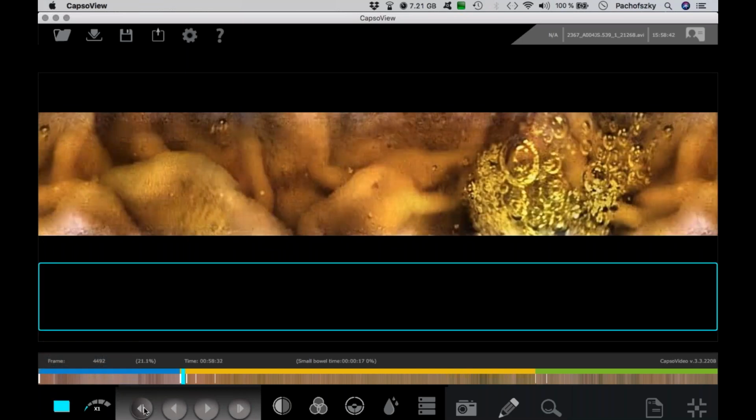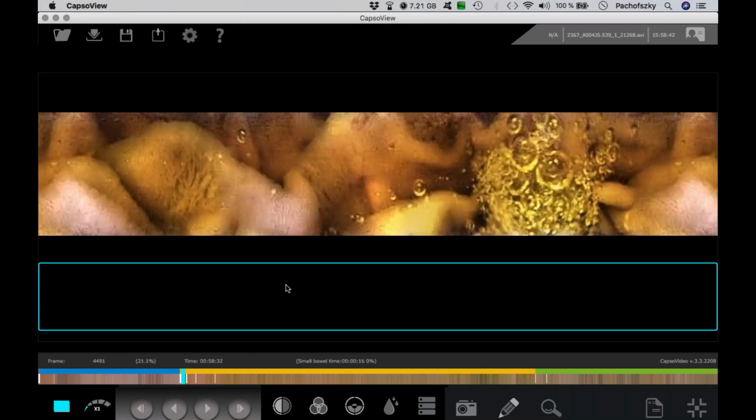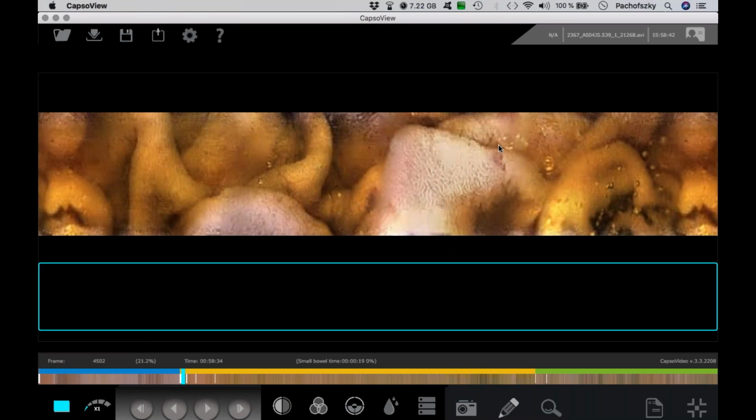You might have seen that I've missed a lesion, but there are so a big number. We've had this before. We have here another small one. We can click here, and we have really a big number.